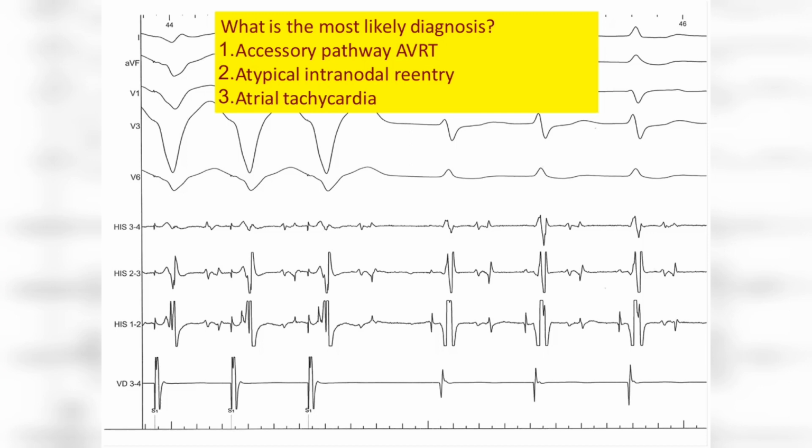And Fernando, I'm afraid this is going to be just a very fast comment. This is a very useful maneuver, not for the previous case, where the diagnosis was evident, typical reentrant tachycardia, but for this case, where we have the typical long RP interval. These cases can be really challenging in the EP lab, and this maneuver is especially useful. So this is a good case. Also, this is a simple maneuver. I want to stress that for the maneuvers we are commenting on now, simplicity is important.